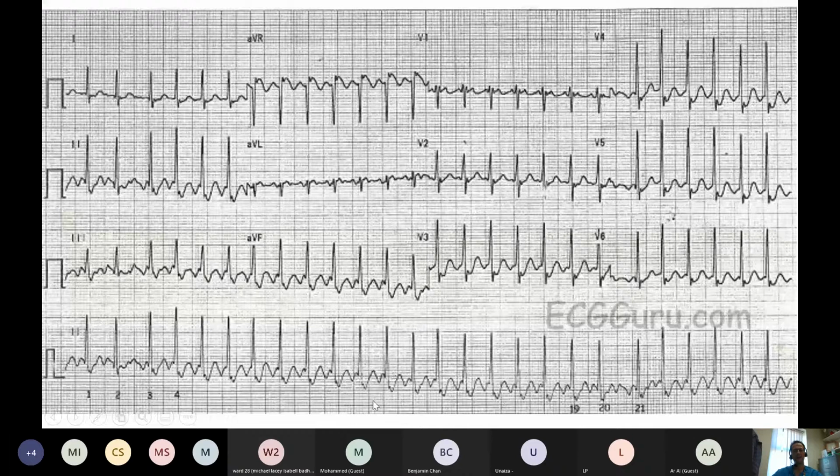Now in atrial flutter, you have a circuit going round and round in the atrium. So in the right atrium, it just goes round and round at a rate of about 300. And every time it gets to the AV node, it tells the AV node to trigger the ventricle. But your AV node, generally speaking, doesn't like going at a rate of 300, but it very happily goes at a rate of 150. So atrial flutter can actually be really quite hard to rate control because you have this very organized circuit. So you have a big shout at the AV node 300 times a minute. It ignores half of those, so you get your rate of 150.